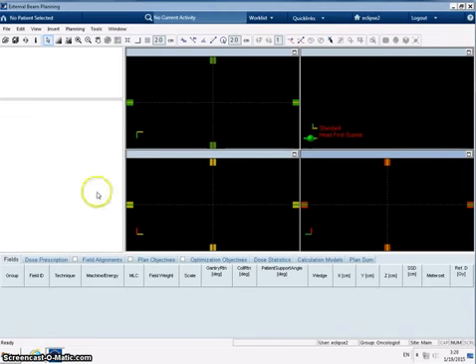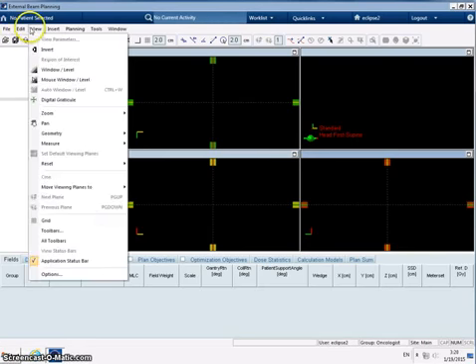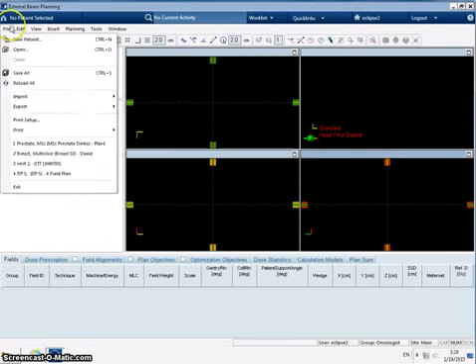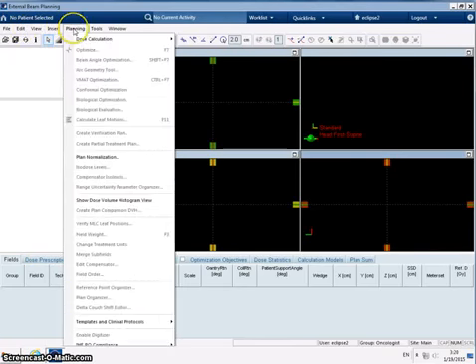And so here we are in the external beam planning module of Eclipse, and because it's a window-based system, you'll be used to seeing a lot of the icons that you can see across here. There's a number of different things we're going to do when we're carrying out these practicals.